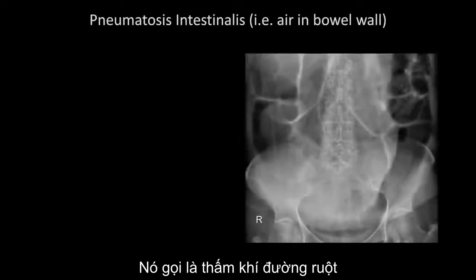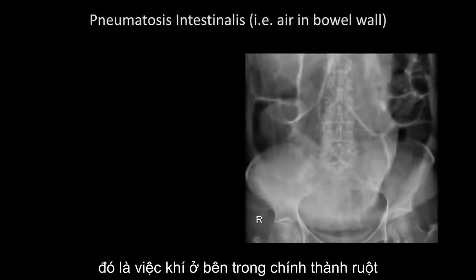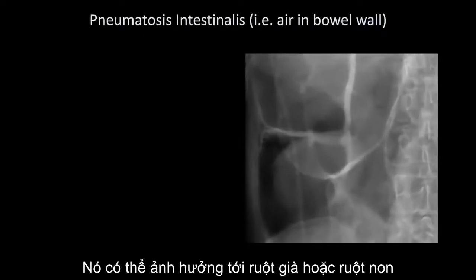The other significant extraluminal gas abnormality is more subtle. It's called pneumatosis intestinalis and is air within the bowel wall itself. It can affect either the large or small bowel.